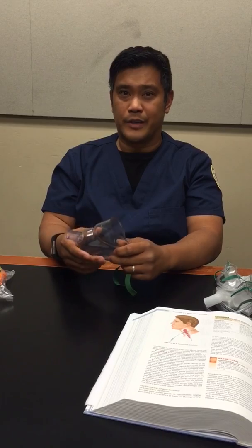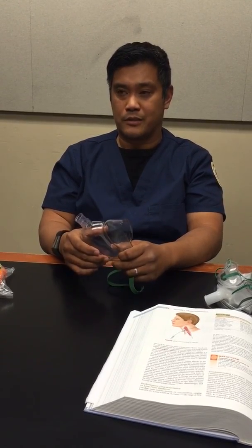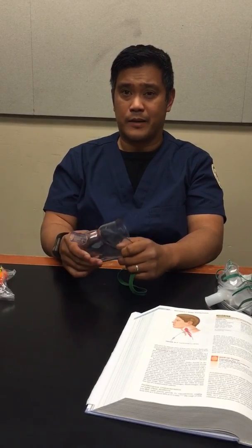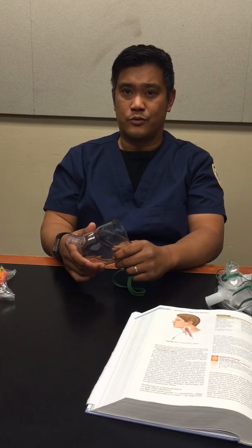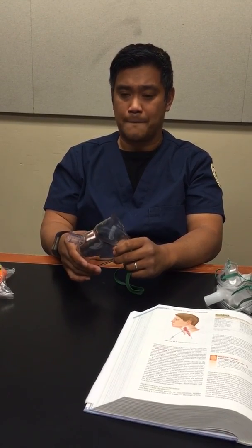The advantage is, similar to the trach collar, it provides temperature control and extra humidity. The disadvantage is that it does have a high infection rate. FiO2 between 20% and 40% is not ensured.